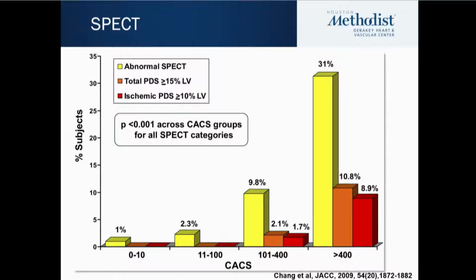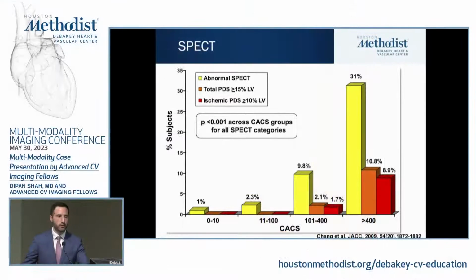Now switching gears to SPECT, I think this institution has a very rich history in SPECT. We love SPECT. I think it's a fantastic test. SPECT, as you know, is all relative perfusion. So basically what it does, it indexes the highest pixel, and everything else is indexed to that hottest pixel.